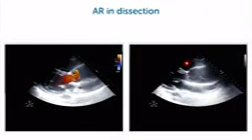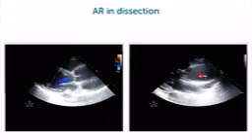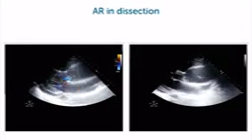But there's another problem that can occur in the aortic root that can lead to aortic regurgitation. Here's an example. Yes, and this is a really great example of aortic dissection. I say great because we can really detect the flap in the 2D image, and which is causing only mild AR in this case. But AR can be very significant sometimes in dissection, especially if the membrane or the dissection goes all the way to the aortic valve, or sometimes you would even see the membrane prolapsing through the aortic valve.